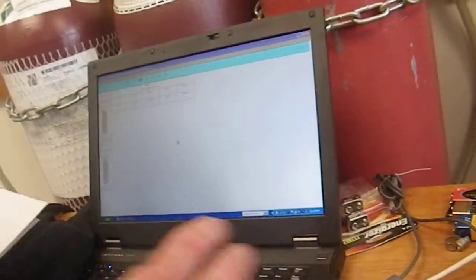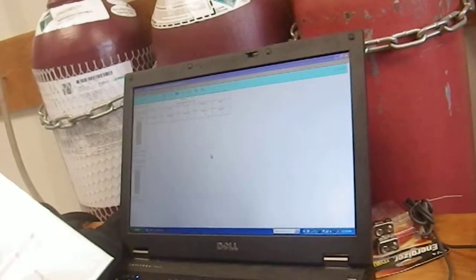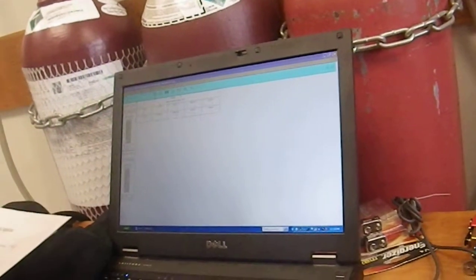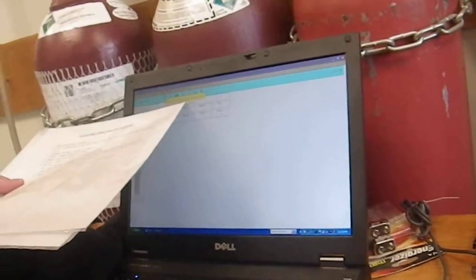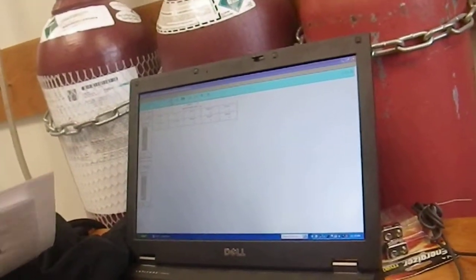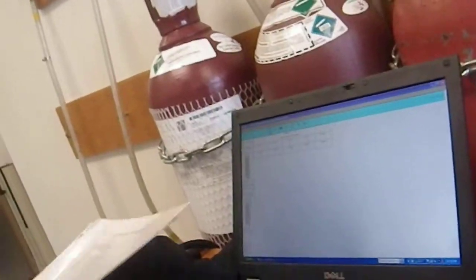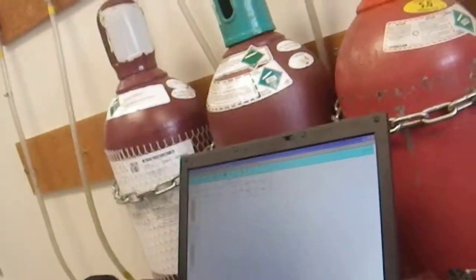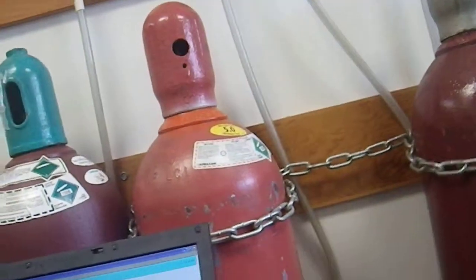From here, this isn't very descriptive, but it says left symbol in the top bar across the screen. It just means this one here. Oh, that diamond with the line. So it says left mouse button to start data acquisition. I don't know if you want to write that symbol down. Yeah, it's a diamond with a line. That was kind of a weird symbol. Anyway, you hit that, and it'll start writing to your text file in real time.